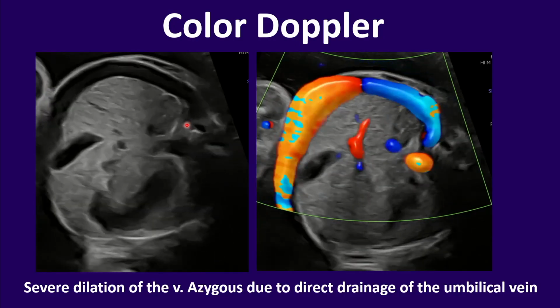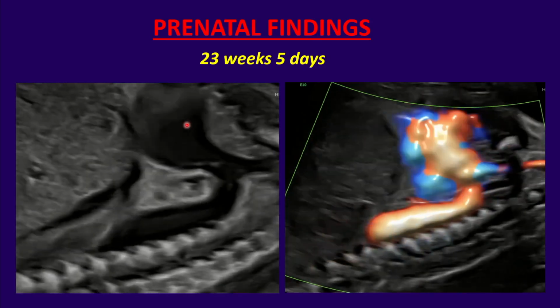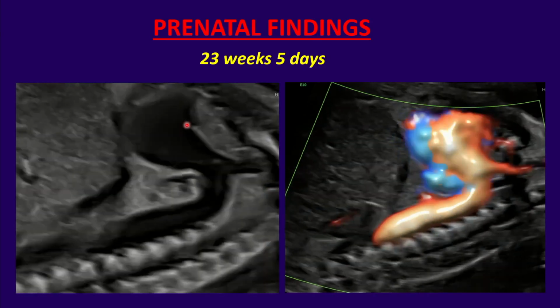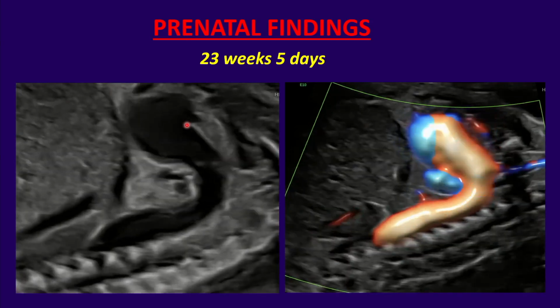Okay, so looking at the sagittal plane, this is the bicaval view, and this is huge. This is the largest azygos vein I have ever seen in my entire career.